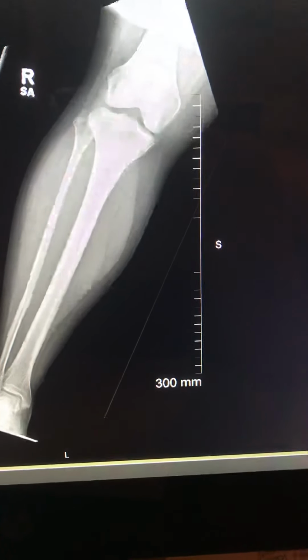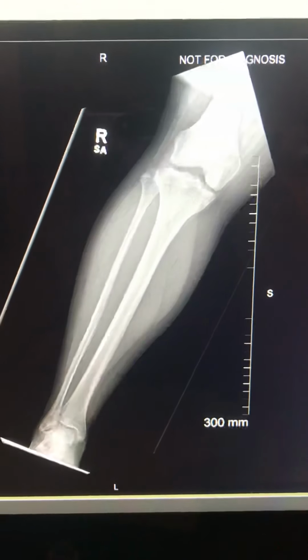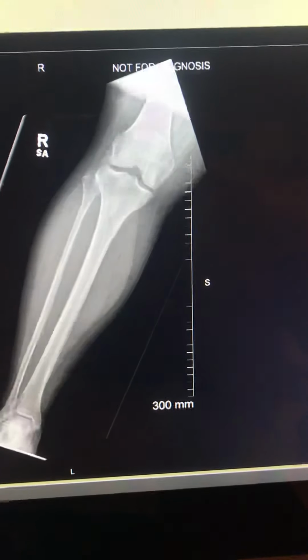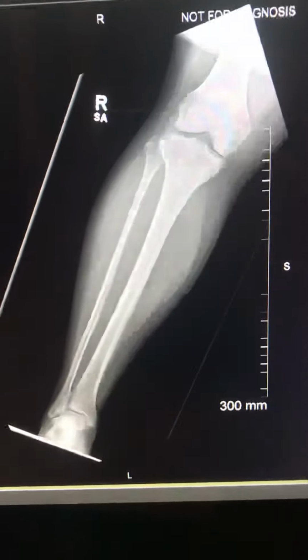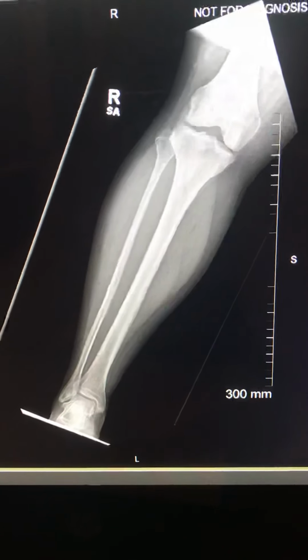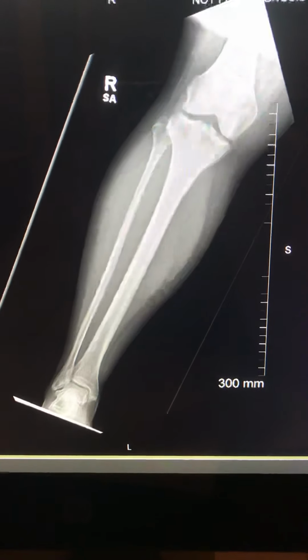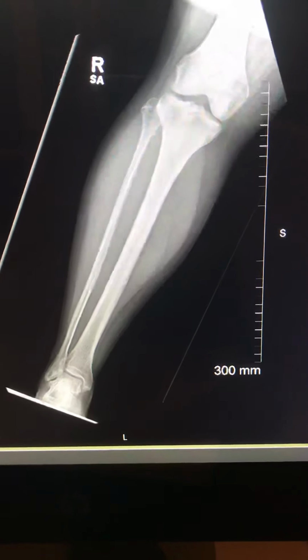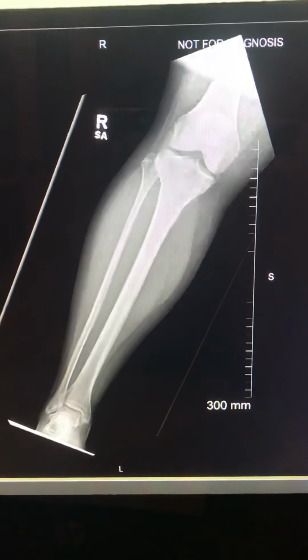Image modality is X-ray. The date of the exam was 6/22. Reason for the request is pain. Projections performed were an AP and a lateral. Age and gender was a female, 43 years old. She was on a gurney, unable to stand. The physician finding was no evidence of a fracture.